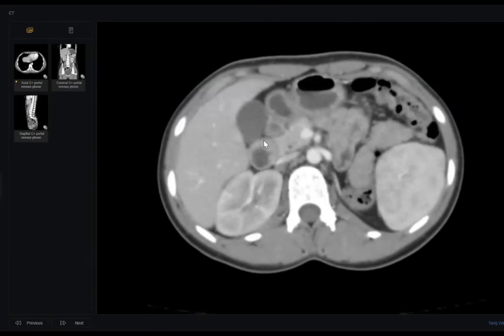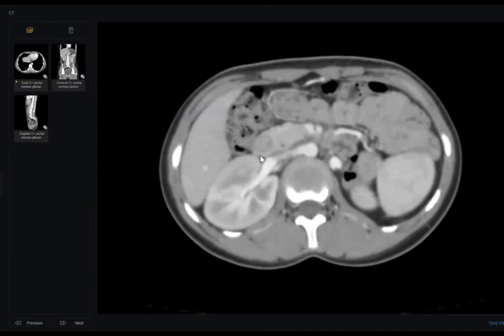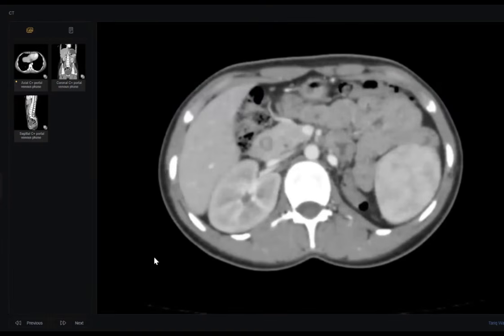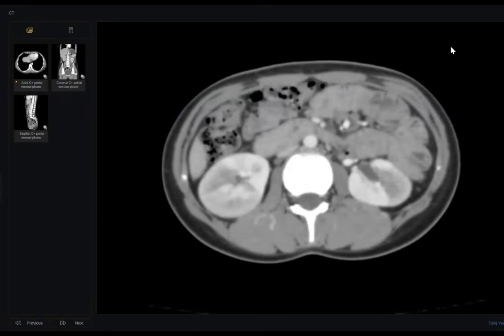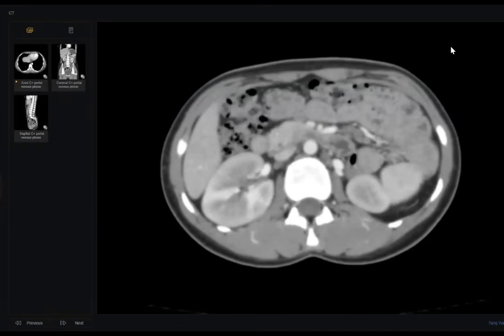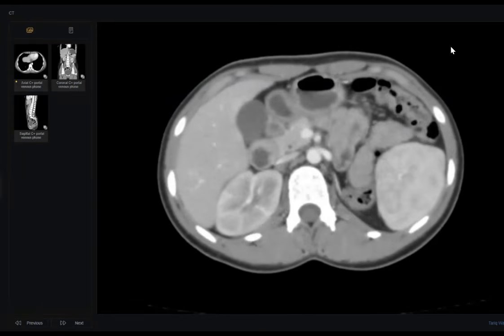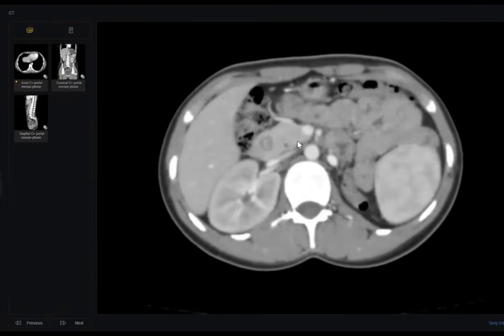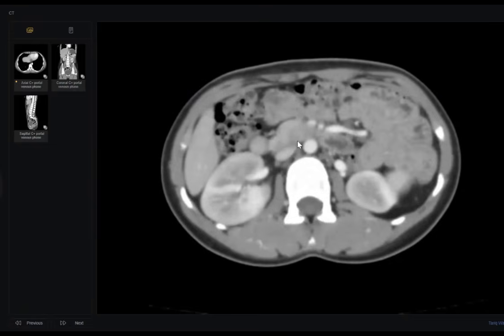After that she said there is dilatation here, and the duodenum is within the pancreatic head, and this looks like a lesion continuous with the duodenum, so it looks like annular pancreas. Annular pancreas occurs due to failure of rotation of the ventral bud. The ventral bud, by the way, is reversed in this image. This is the ventral bud, which forms the posterior part of the head. This one should rotate to come here, to form the posterior part of the head.